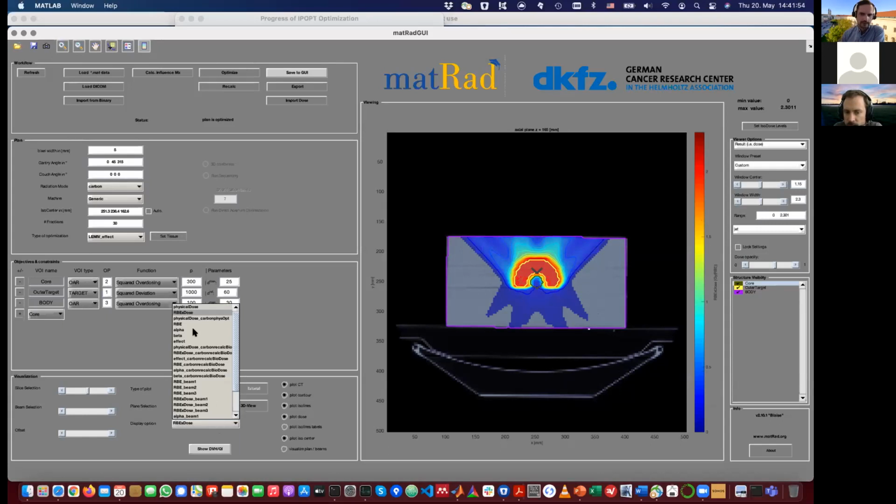What's more interesting now is the physical dose, because from the previous example, you know that if we apply a homogeneous physical carbon ion dose, then we have these non-linearities, and we highly overdose the tumor, especially in the distal part.